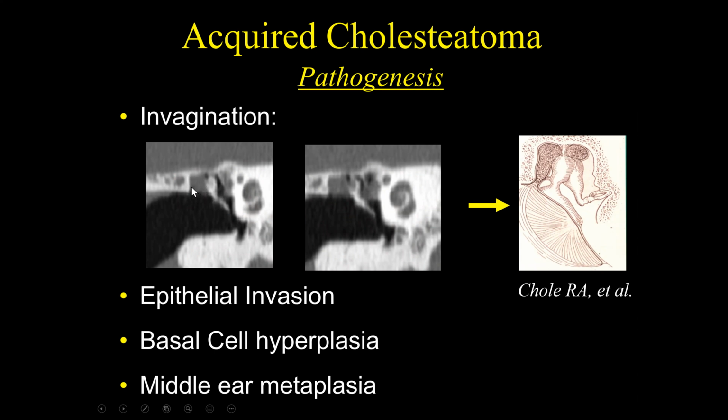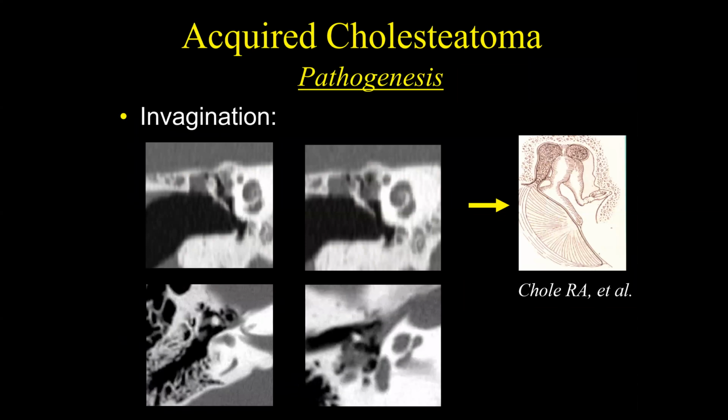Here we see this cholesteatoma that's located in the classic location where we would see the pars flaccida being retracted superiorly into the epitympanum. And when we look at this coronal image, we can start to see subtle erosion here involving the head of the malleus. So that's a nice example of an attic cholesteatoma. And because the ossicle is now disrupted, this would result in conductive hearing loss.